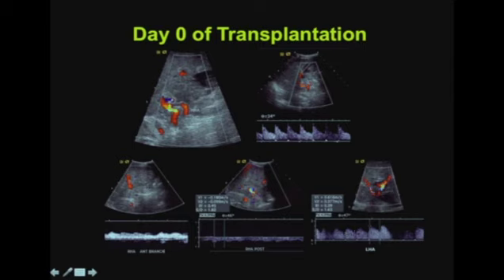It's somewhat dampened, and it has increased diastolic flow, implying that it may be very dilated distal to a site of obstruction. Also note that these additional arterial branches show very abnormal arterial flow.